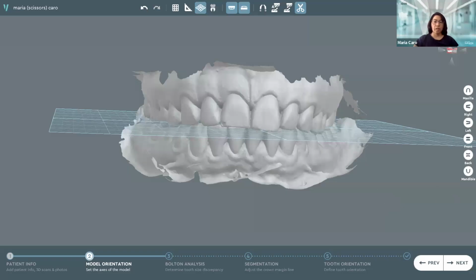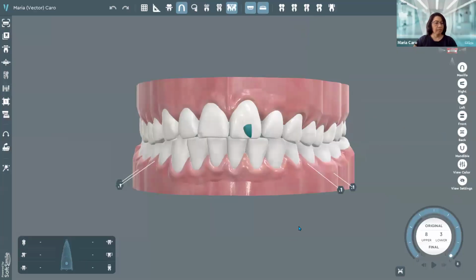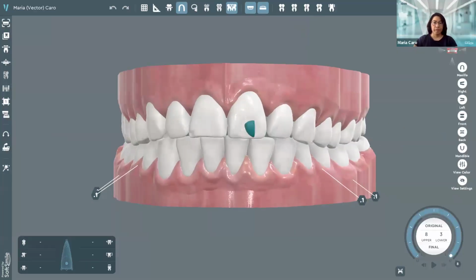Next, we're going to be covering the orientation and comparison models option. So we're going to move into the setup scene from another case. There we go. And let me make sure that you're seeing that, because as I switch screens, sometimes that stops sharing. Okay, I believe you are.